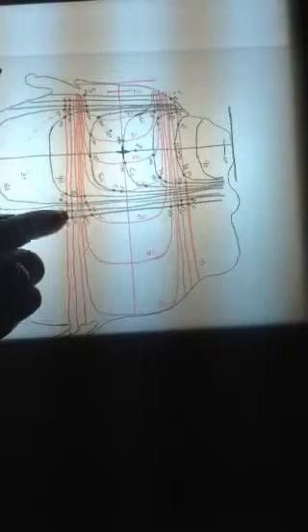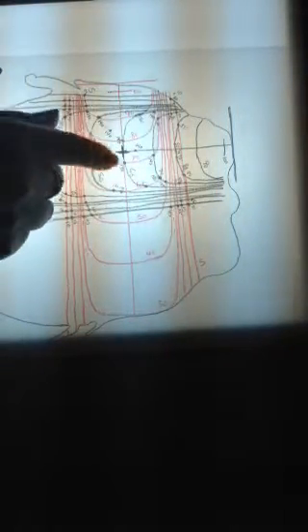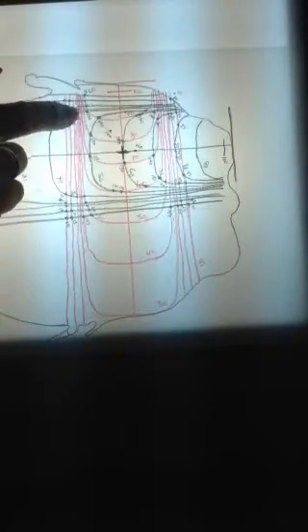But so for example, this would represent 10%. This point right here would be 15% because the 5% of the red is crossing the 10% of the black. Over here, for example, this would represent 85%. That's because the 5% from the red is crossing or intersecting the 80% dose line from the black. That's 85%. And I found some points over here that are 90%. There's an 85% there. I've gone over in this corner and found all of the intersecting points and found 10%, 15%, 45%, 60%. Over in this area, you see higher dose line points.